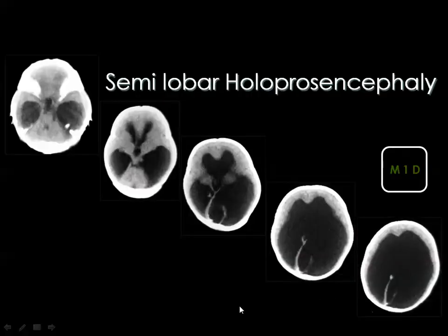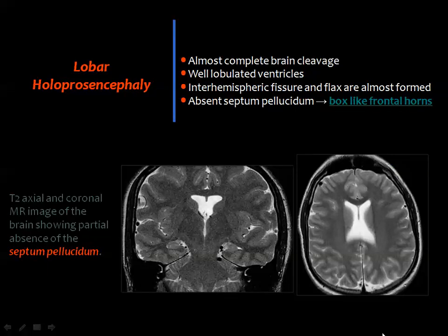This is also an example where you see more attempt at the differentiation of the lateral ventricles as well as the third ventricle. The posterior fossa is good. The supratentorial ventricles are fused together, forming a single cavity. In lobar holoprosencephaly, there is almost complete brain cleavage into two cerebral hemispheres and well-lobulated ventricles.